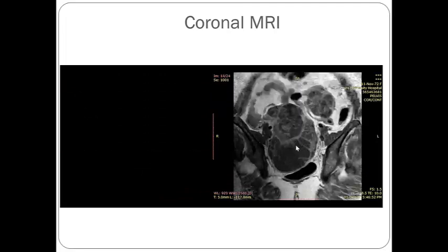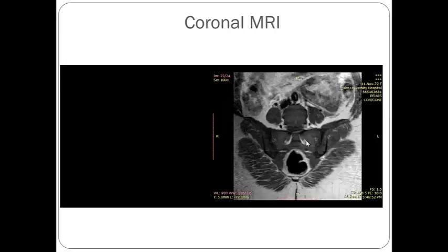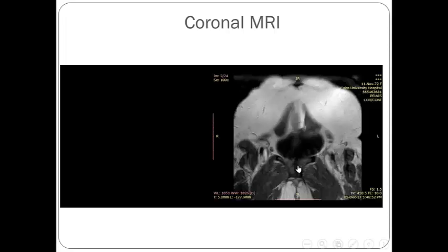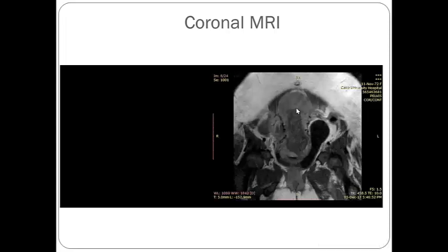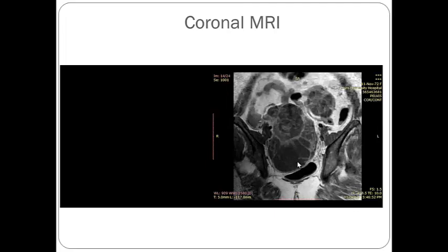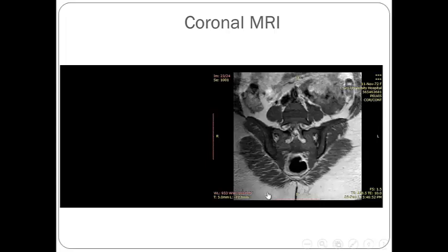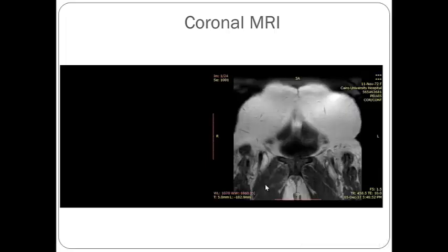But on post-contrast, the solid components in the ovary are enhancing, of course, and the septum, and also the mass here takes delayed enhancement, not early enhancement, and this may be more with endometrial carcinoma. But in these large cases, it's no problem to see which is the first.